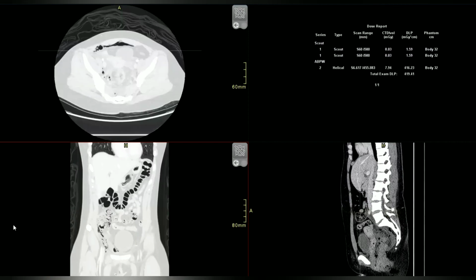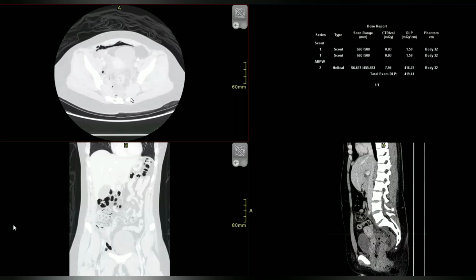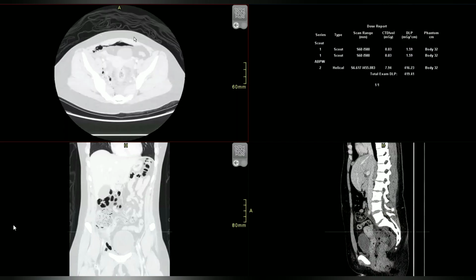Okay, there is subcutaneous air here as well. Sometimes it's difficult to tell, but with this much air, see, there's nothing here. So it is not in the peritoneum. Okay, and it is mostly along the vessels. It's mostly subcutaneous. It's around the rectum. So, okay, so now what are you... Sorry? I was just confused. That's a bowel loop just behind the anterior abdominal wall.